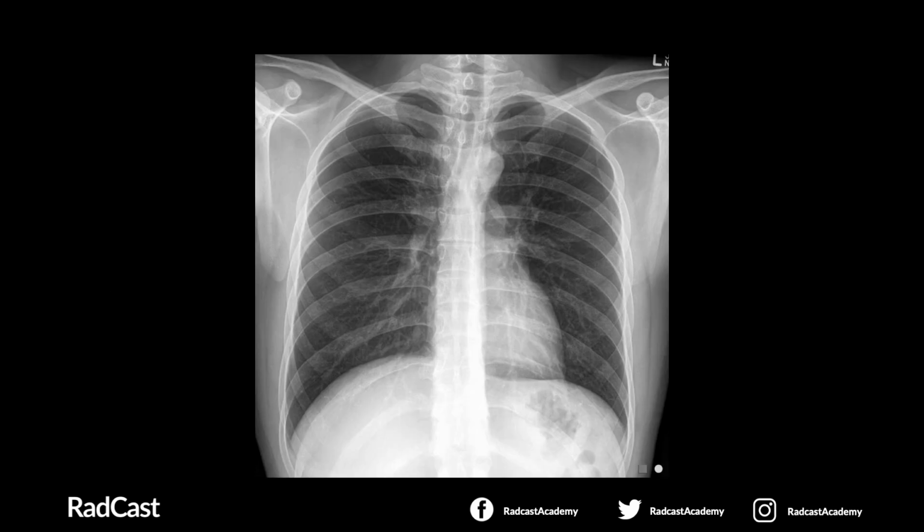Once again, let's refer back to our normal chest X-ray to have a look at the diaphragms in more detail. We can see here the right hemidiaphragm and the left hemidiaphragm. The right is higher than the left. We can see here the presence of a gastric bubble. The costophrenic angles are sharp and well defined here. There are no signs of any free gas under both hemidiaphragms. Therefore, this is a normal appearance of a right and left hemidiaphragm.